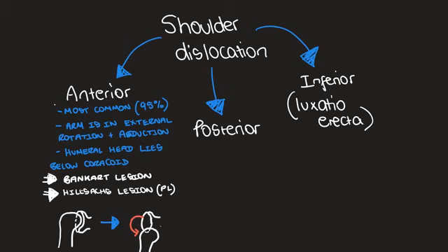There will now be a defect in the posterolateral humeral head, and this is in keeping with a Hill-Sachs lesion or defect. Corresponding to this, in the anteroinferior labrum, you'll get some injury as well. That can either be soft tissue or bony, and that's a Bankart lesion.